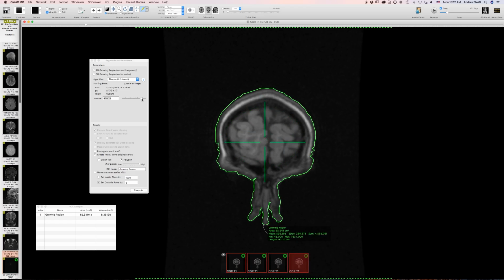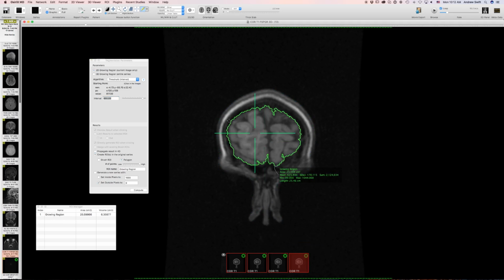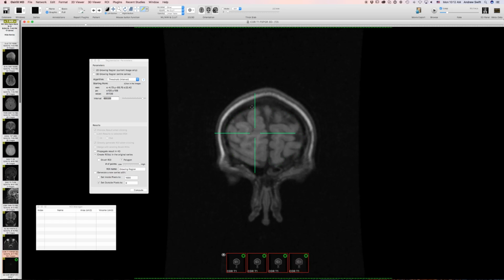Okay, so that's not what we want. So then we'll grab the slider and adjust it this way. And if none of those are what we want, we will click again inside the image. That is what we want. So this is the process. Now we have to delete. I just hit the delete key. Because I had clicked in here, this box was no longer highlighted, and that's why it didn't delete these numbers. It actually deleted the ROI. It's not perfect. Sorry, folks.